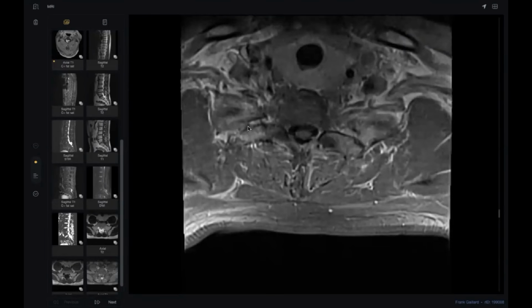I would like to check the brain and the rest of the spine. I saw the rest of the spine, there are no additional lesions. So I would like to check the brain for any associated brain masses. These patients need to be urgently referred to the neurosurgical team for biopsy and histopathology. In your opinion, in this age group, what is the most common differential diagnosis? Okay, ependymoma. It's accepted. Are you sure? So astrocytoma. Are you sure?